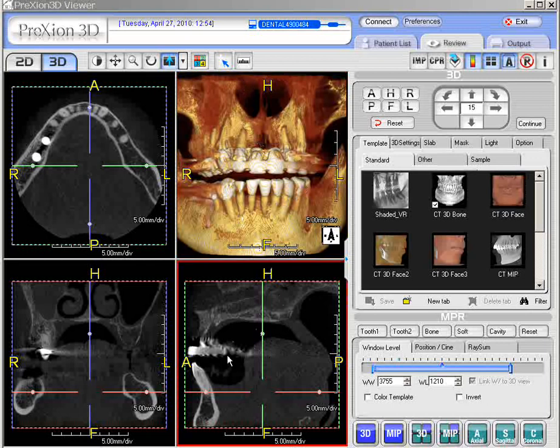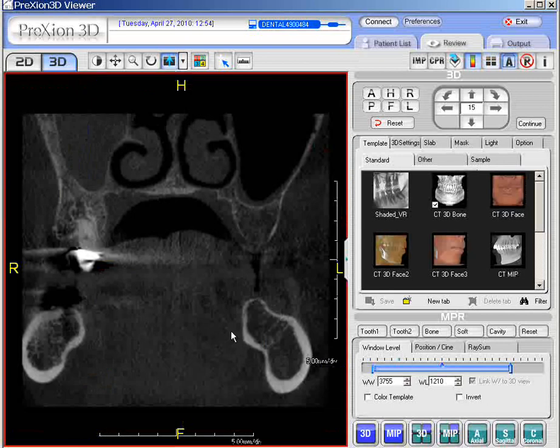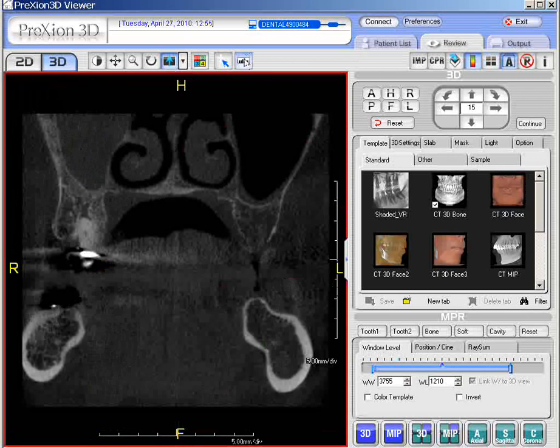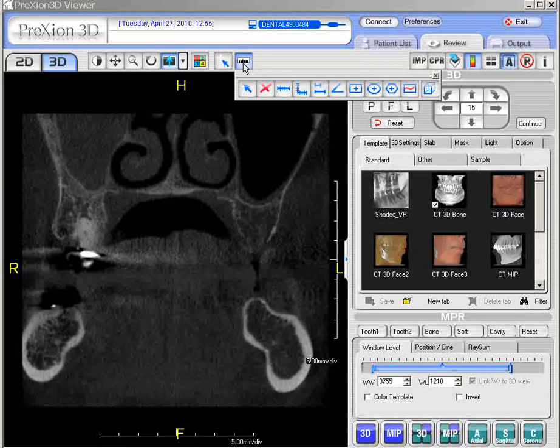Now, if we want to measure a function, first of all, after we survey and pick a section out in any of the frames, we can launch a particular screen, or you can stay in the 3-in-1 format, whatever one wishes. Go up to the upper toolbar, and you'll notice the last one is the measurement icon. It looks sort of like a piano, if you will, a little ruler. So if you click it, it's going to open up these tools in the toolbar underneath the measurement tool. Generally, the most widely used function in the toolbox is going to be the measurement distance icon. So if one holds the arrow to these particular icons, they'll tell you what these are.